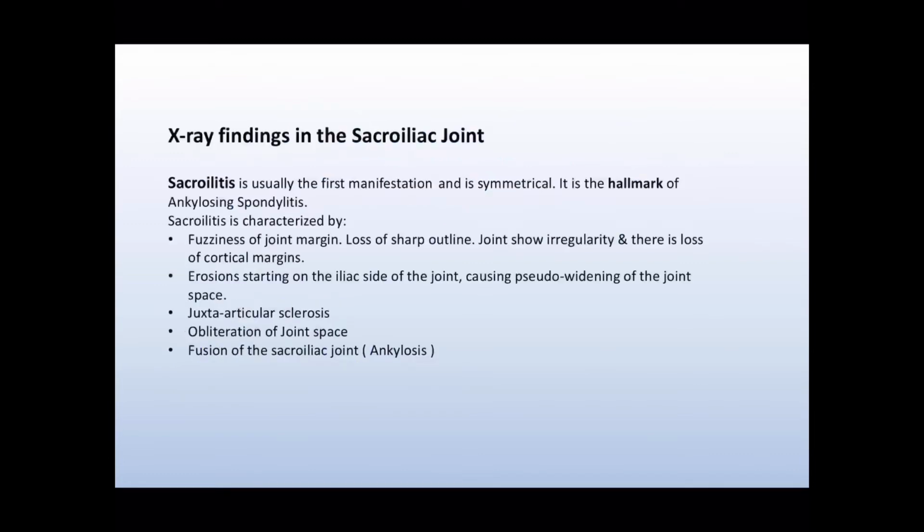Faisal Abdullah from Bangladesh, and today we will discuss the radiological findings of ankylosing spondylitis. We shall discuss the radiological findings in two joints. First, the sacroiliac joint, and then we will discuss the findings in the spine. So first, let's study the sacroiliac joint.